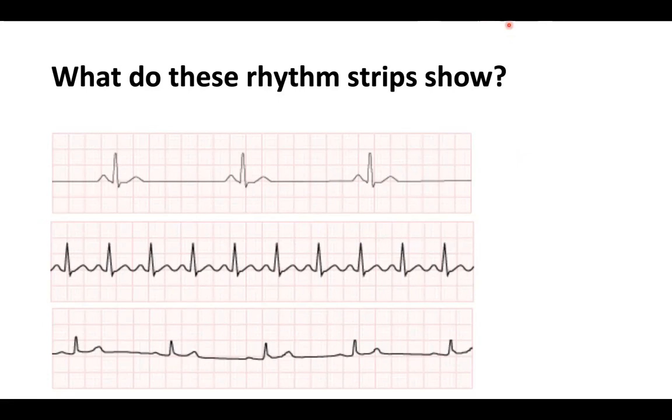Okay, so someone has said sinus tachycardia for which one? Yep, the second is sinus tachycardia. Anyone have an answer for the first and the last? Is it just bradycardia, the first?